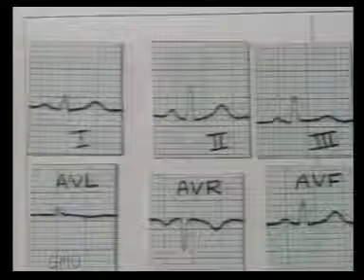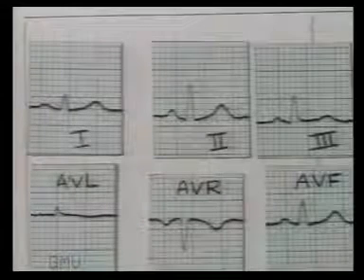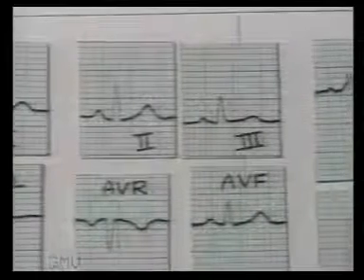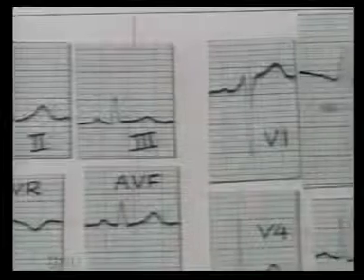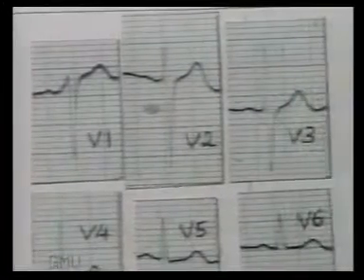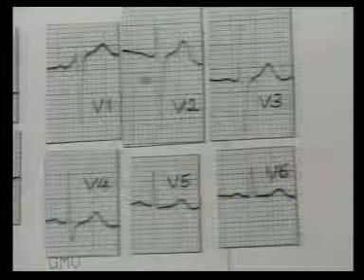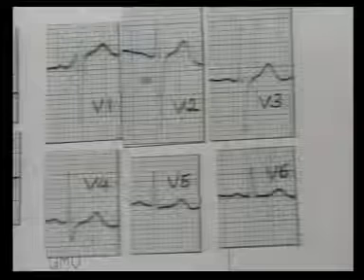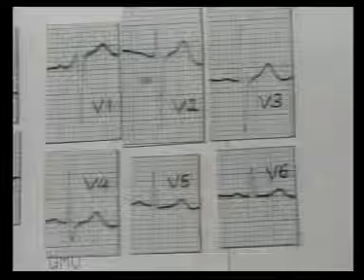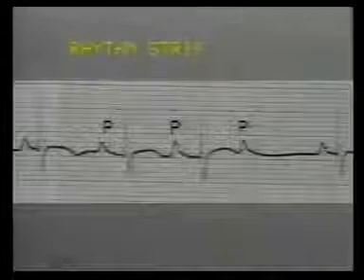Next, we come to the ST segment. If the ST segment is elevated or depressed, the pattern must be studied and clinically correlated to myocardial infarction, myocardial ischemia, pericarditis, and ventricular strain patterns. Lastly, we study the T wave morphology and note the leads where it is tall, flat, or inverted. The details of STT changes are studied in the next section of this cassette.